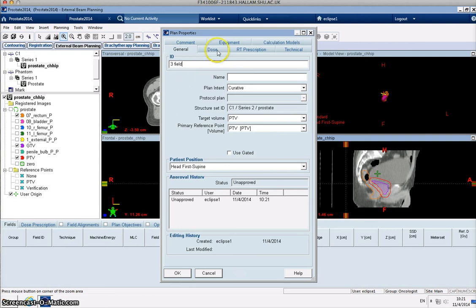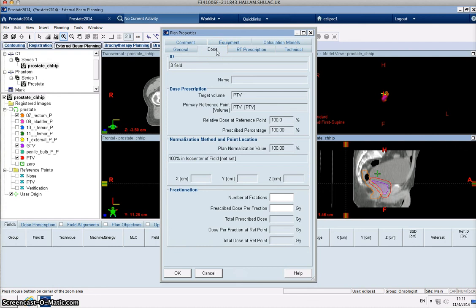And then the other thing that I want to do is we need to tell it how much dose. So we're going to give the patient 37 fractions, and we're going to give the patient 2.05 gray per day, which adds up to 76 or just under. Obviously if that number came wrong, then that would spot it out. The easy thing to do is this, so we could do 76 in 37, which is the common way we're used to writing things down, and if we do that we can see we're giving the patient nearly 3000 gray, so that hopefully highlights that to us. So 2.05.